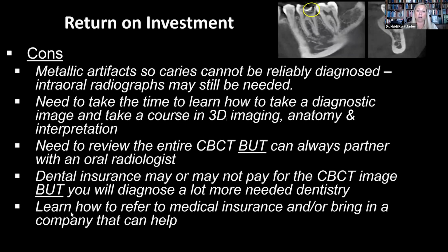Our cons: metal artifacts. So here we can definitely see we have some beam hardening artifacts around a metal restoration. Doesn't necessarily mean that that patient has cavities. So we do still need to take those intraoral bitewings. Please don't diagnose all of your cavities off of a cone beam CT. There's going to be a high chance of false positives. So we've not moved beyond the all-in-one imaging yet. CBCT and 4 bitewings. Yes, we see people taking that a lot.